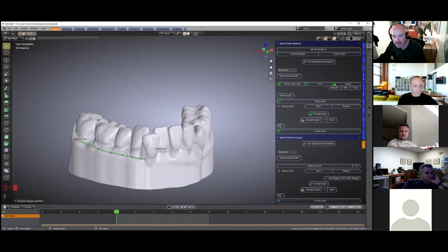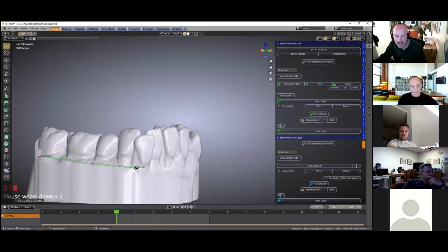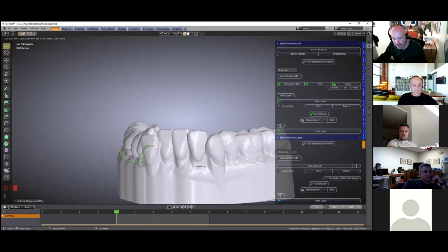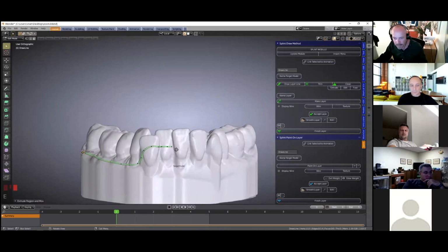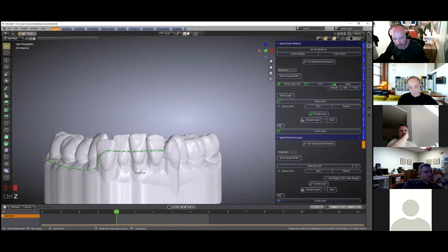So it depends on how you want to make this. It's a good idea to engage undercuts where you want. See, we'll go down.